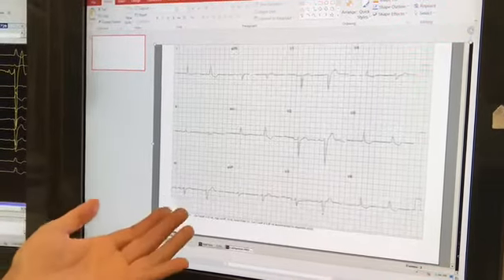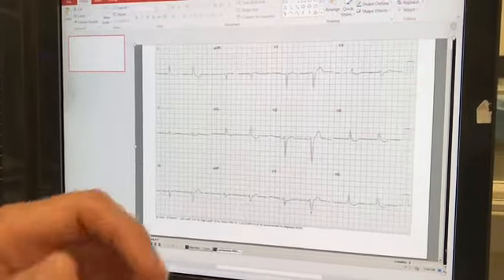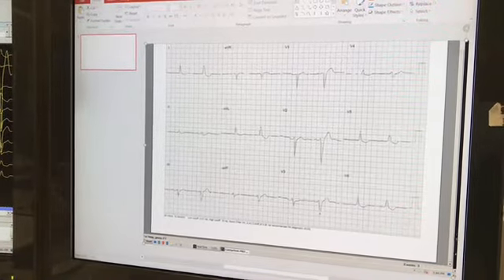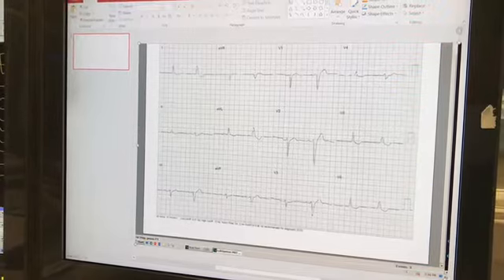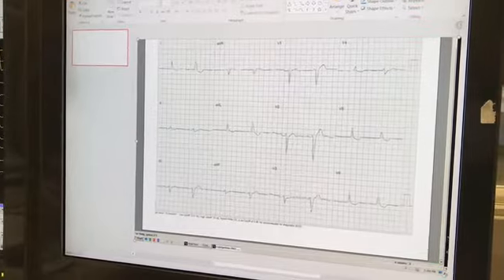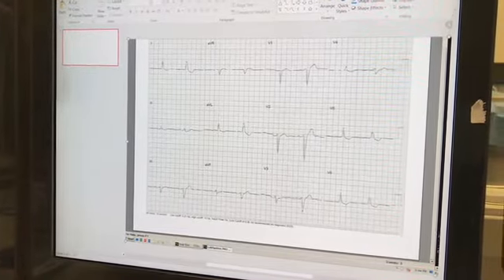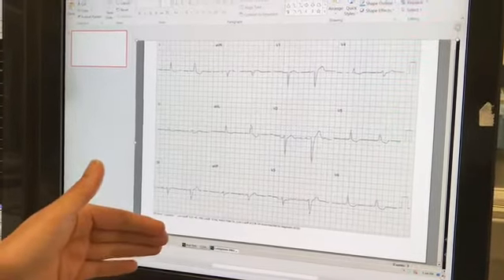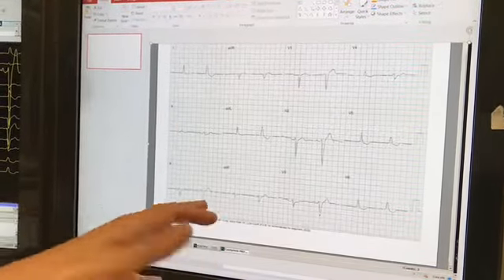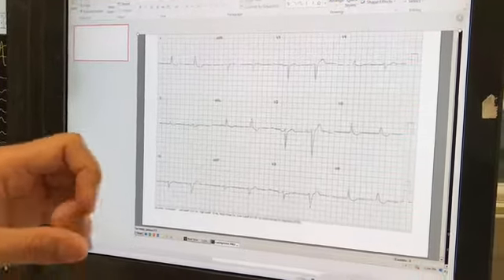So what's going on here? This patient has had a TAVI and pre-TAVI had a normal PR interval of about 180 milliseconds. Post-TAVI, she had a PR that prolonged to 220 milliseconds with the QRS approaching a left bundle branch block appearance with a QRS duration of 140 milliseconds. And as she comes to the pacing lab to be paced, she displays this alternans phenomenon. So let's try and understand this alternans phenomenon and really highlight a point that is quite important post-TAVI.